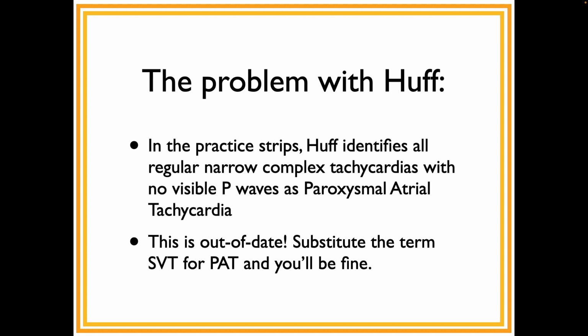So when you're practicing, you see something that looks like SVT, you go to the answers and say, I thought it was SVT and it's paroxysmal atrial tach. You are right, she is wrong. Okay? So it is SVT.